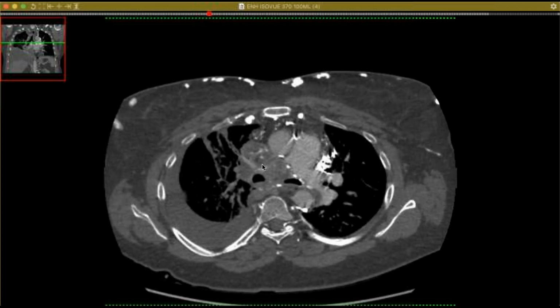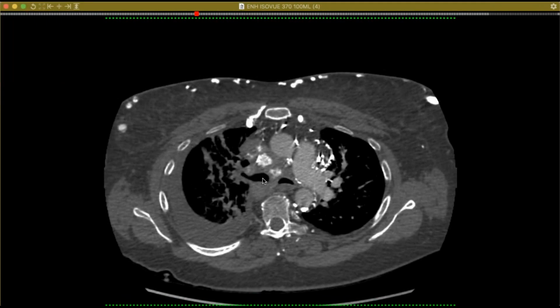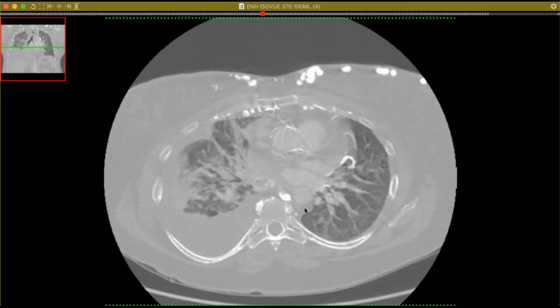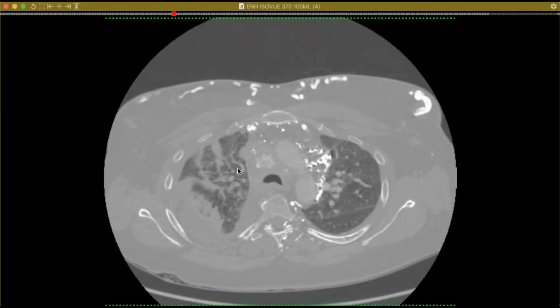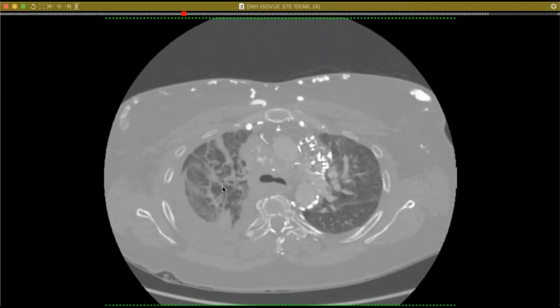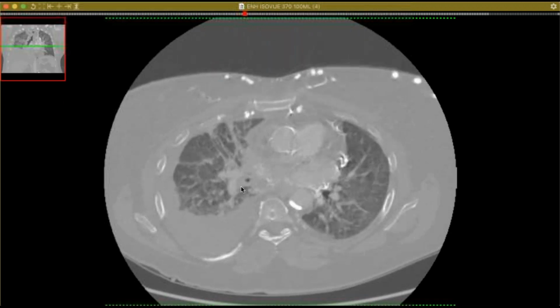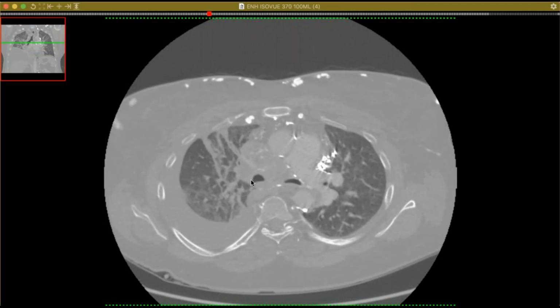It's got the big calcific mass, which is the most common, but typically when you see this, it's more likely related to histo than when it's just non-calcific soft tissue. And then if we look at the lung windows, you can see just the effects of the impaired venous drainage and just overall poor aeration of that lung. There's bronchial wall thickening, which is probably lymphatic and venous, just edema in the lung from the impaired venous and lymphatic drainage. We can't see the lymphatics, but the presumption is they're also obstructed because the veins are out.